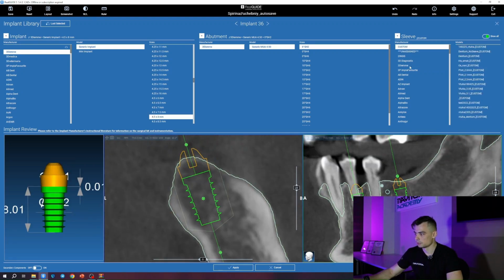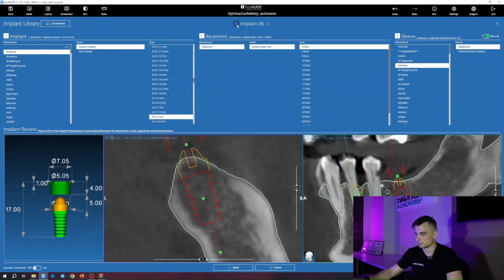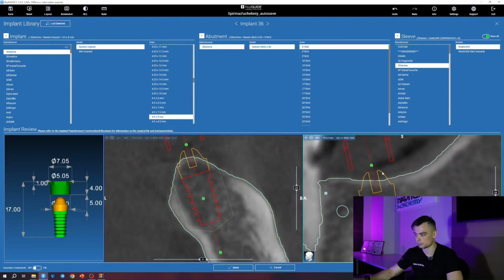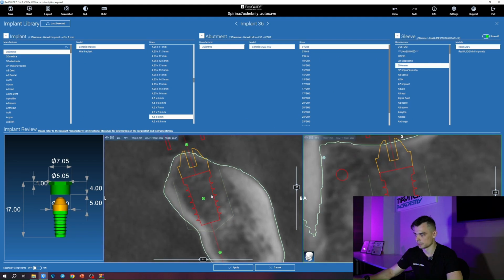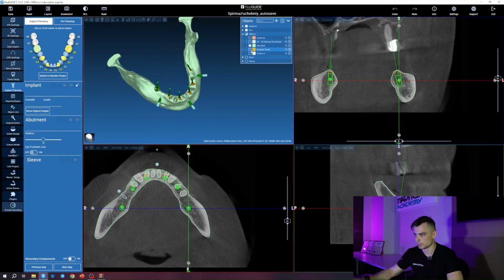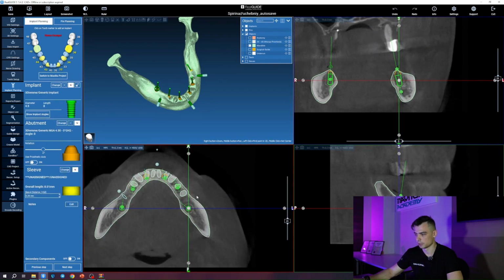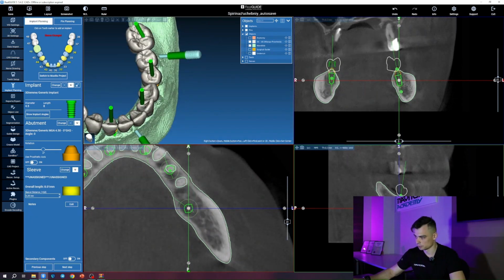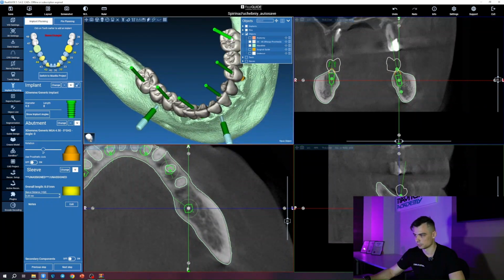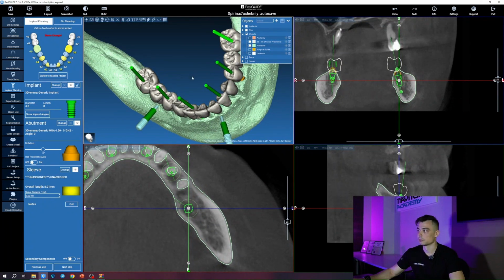Now, let's select here again. Right now my sleeves are highlighted in red, as you can see, but okay, sorry. By the way, I moved the wheel by mistake. That happens quite often. Now I'll press cancel to undo all the changes. Okay. So this implant of mine has shifted. I just got caught by this thing where at a certain stage, when you move the wheel, your implant shifts, you just misclick, and that's it. So now you'll also know that this can happen. Now we'll reposition the implants. All right, everything's okay.